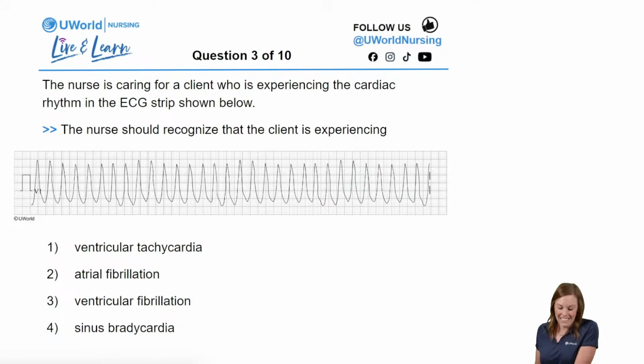All right, what are you guys seeing? Let us know in the chat. A lot of good answers coming in. You guys are asking how long the strips are. You will either see strips in 10 seconds or 6 seconds, and what we have today are 10-second strips. Good job, you guys.